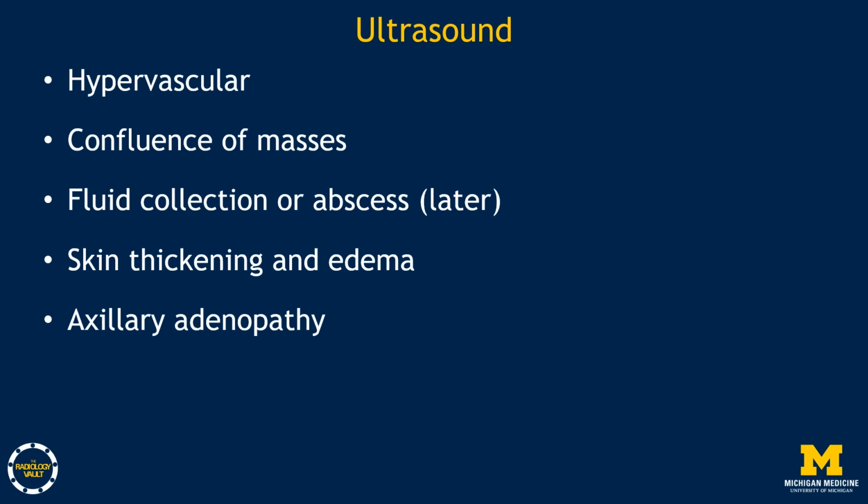On ultrasound, you may see hypervascularity due to the inflammatory component. There can be a confluence of masses, a fluid collection, or possibly an abscess later on, skin thickening and edema, and axillary adenopathy.